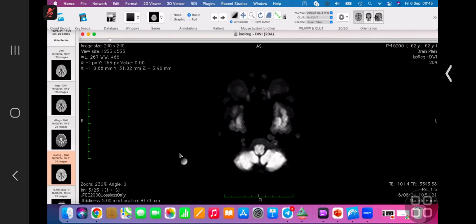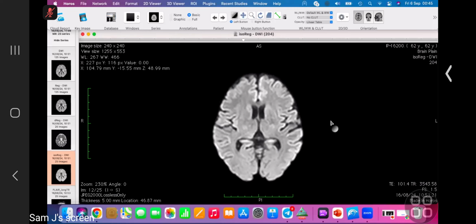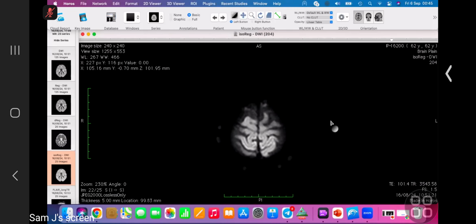History is withheld. I'll share the history later, you just scroll the case. I'm presented with DWI, axial brain MRI. I'll scroll through the images, then comment about my findings.